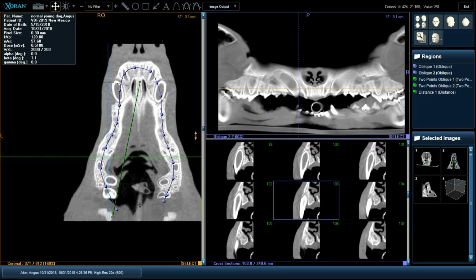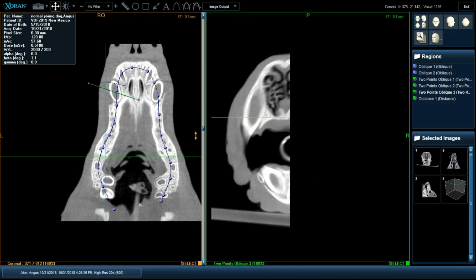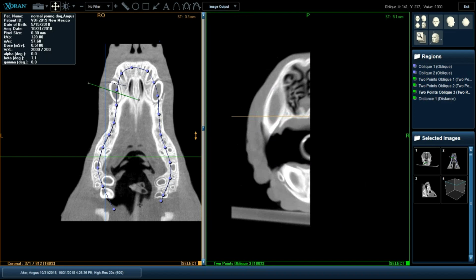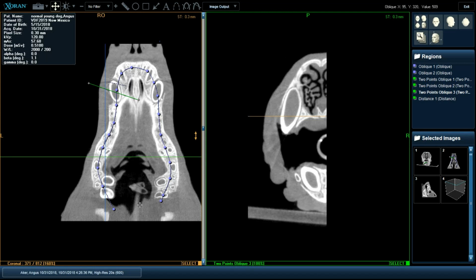So let's take a quick example here and assume that we are interested in looking at this canine, this left maxillary canine, and we want to take that into consideration and look more carefully at a particular pathology here. What we would then do is make a section of it virtually. So now I'm cutting this tooth buccal lingually, and very quickly this will come up on the screen.